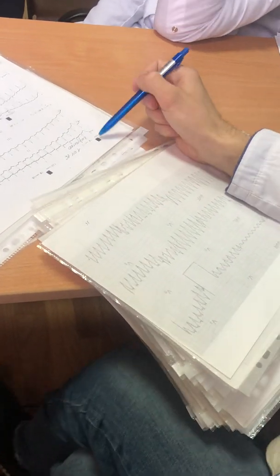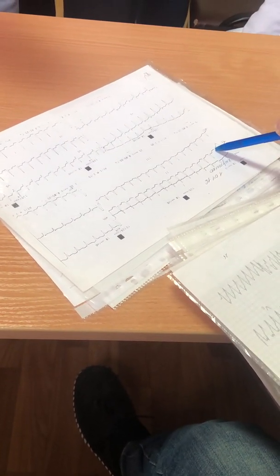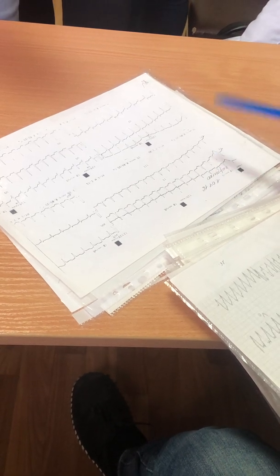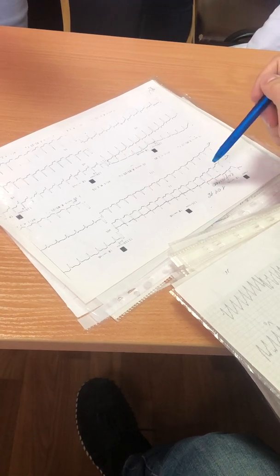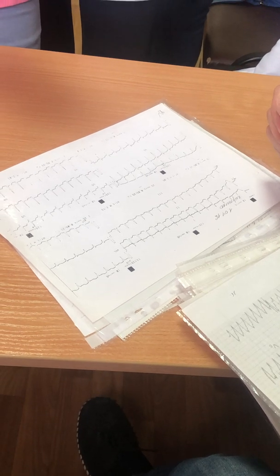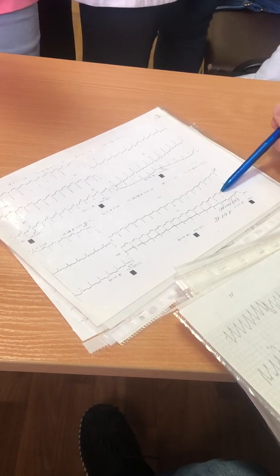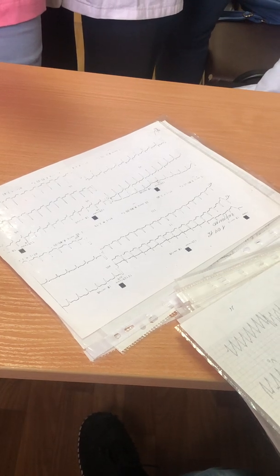When you check cards with tachycardia, you need to compare sizes, check size of QRS complex. This patient has tachycardia and QRS complex, it's normal. Size of QRS complex less than 0.12 seconds. That's why it's supraventricular tachycardia. To find is it sinus or non-sinus tachycardia, we need to check P wave. P wave is absent, it is non-sinus supraventricular tachycardia.